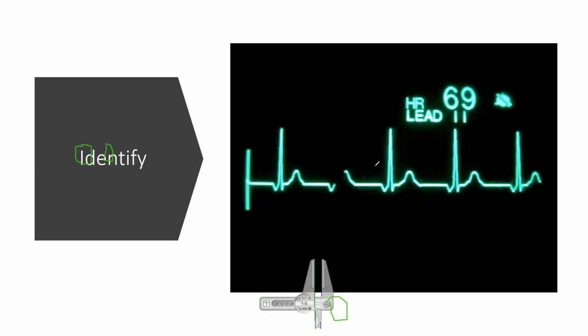Okay, so the major observation that you have noticed is the inverted P waves, correct? And we said that inverted P waves originate from the AV node, and we therefore call them junctional something. The rate over here is 69.